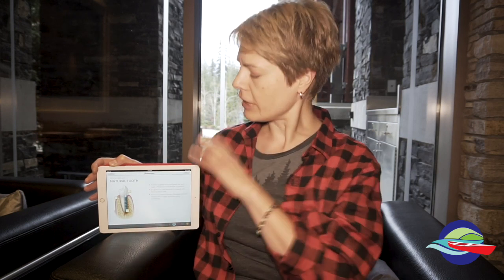So my name's Assunta, and I'm going to explain the process of how we explain things to patients so they understand the dental implant process. And my favorite teaching aid is the iPad. I have an app on the iPad that's developed by one of the implant companies to help me aid.